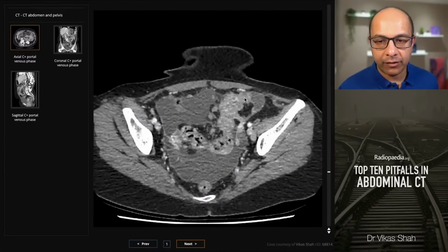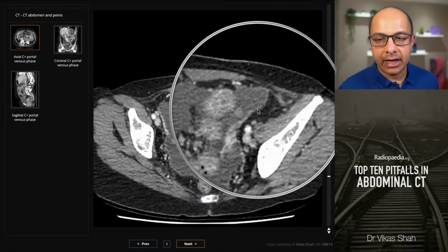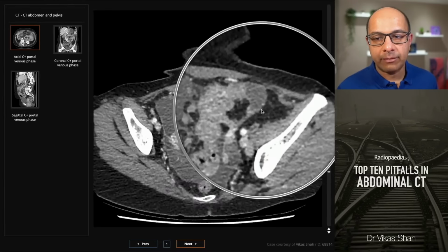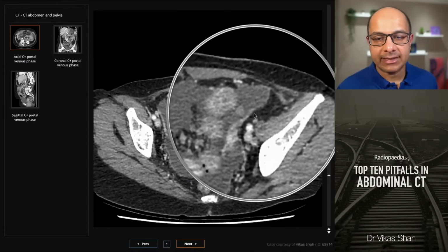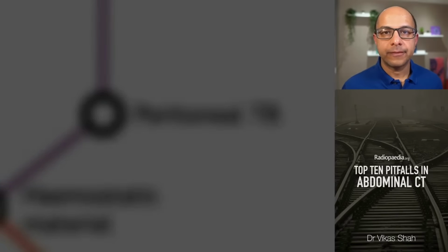There's a little bit more here in the pelvis. And then also this nodular appearance to the peritoneum. You shouldn't be able to really draw a line over the peritoneum. You shouldn't be able to see that clearly. So that's a sign of peritoneal involvement by tuberculosis.